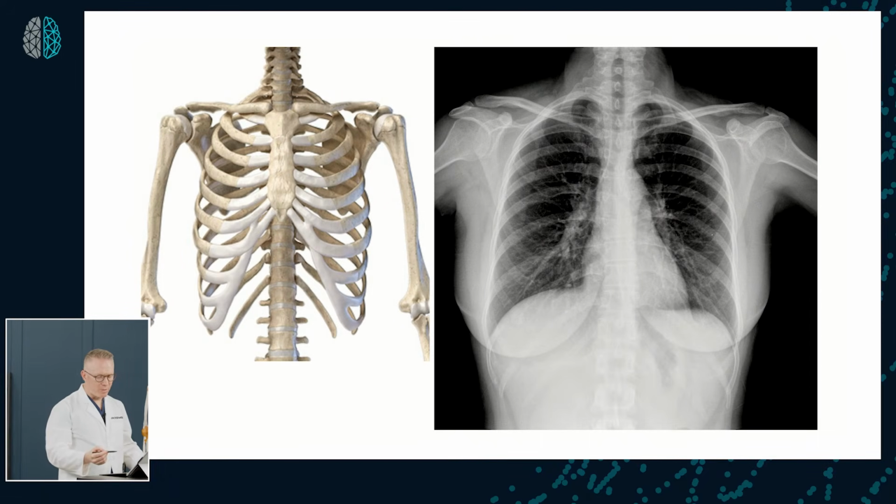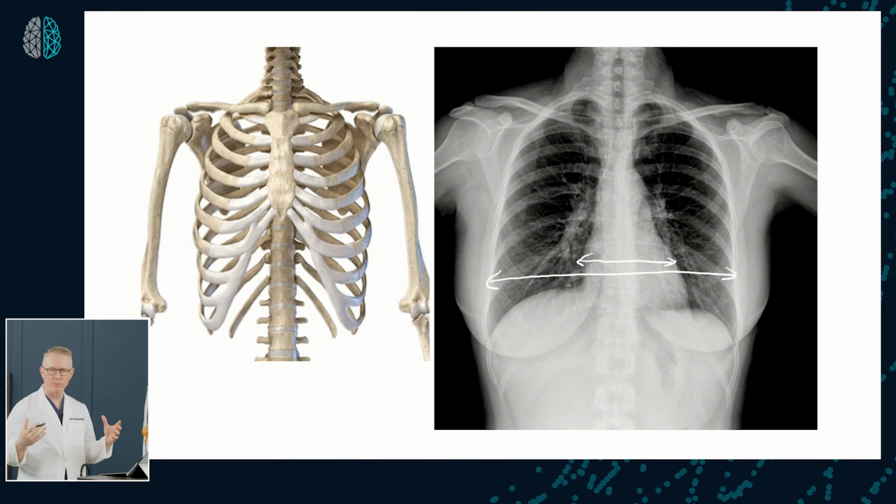I also wanted to take a moment to reinforce the point that I made earlier about the cardiothoracic ratio. Again, this is where we're typically looking at the overall width of the cardiac silhouette and the relationship of the width of the lung fields. If that were to exceed 0.5, or more than 50%, which in this case is not, then this AP, which has a larger heart potentially than is actually on a PA, there's no evidence here of cardiomegaly, okay?